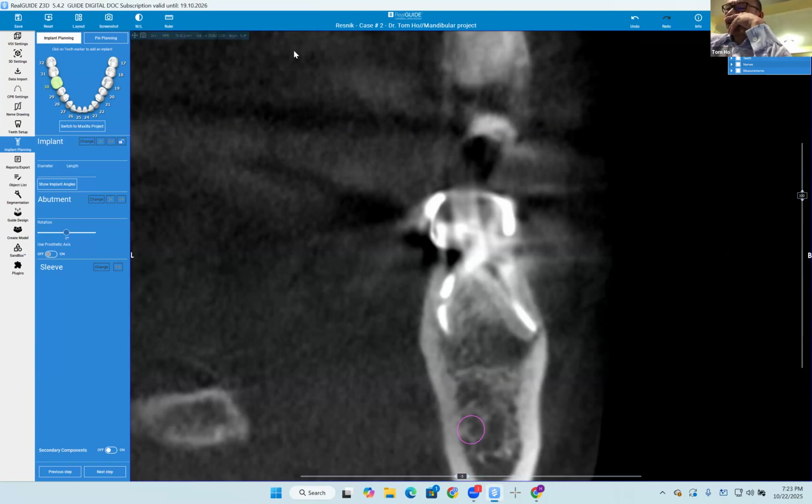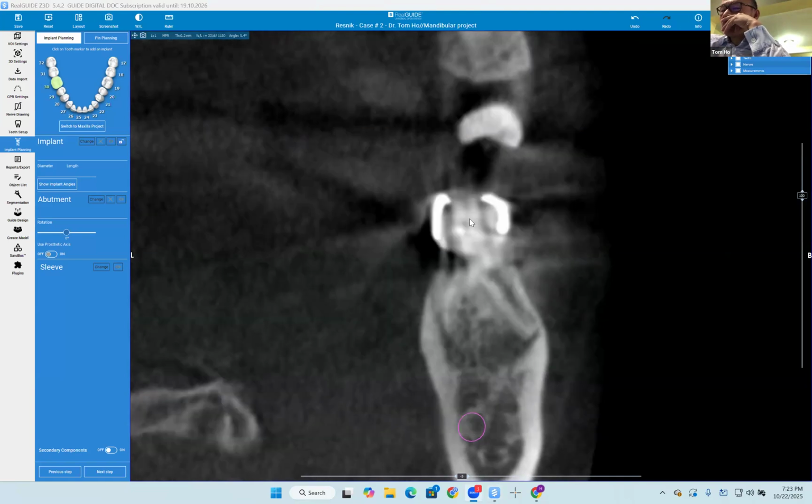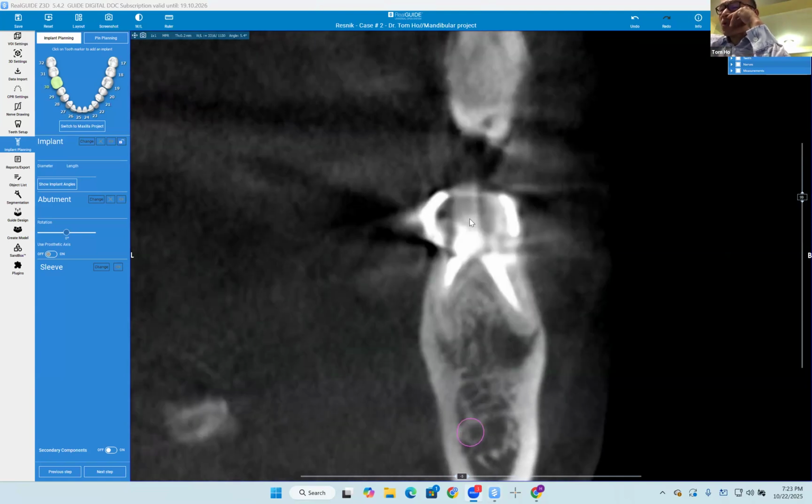Okay. So this tooth after endo treatment is not healing up, even though the apical radiolucency has decreased in size, but much better as compared to the original. Oh wait, I thought you said it increased. No. It's decreased in size. Now it's half of the size it was before. Oh, okay. I misunderstood. Sorry, I thought you said it increased. Then don't do what I said and just watch it.